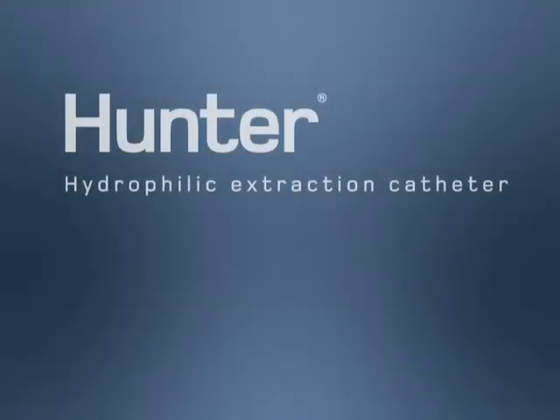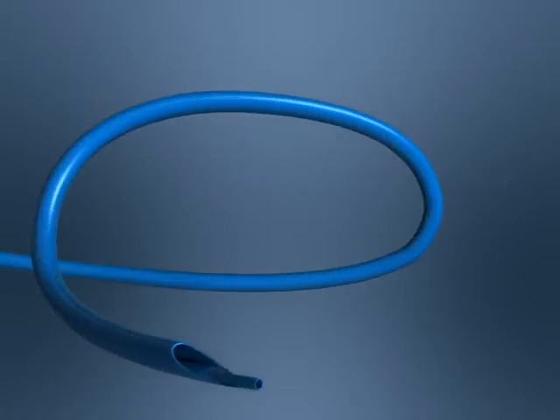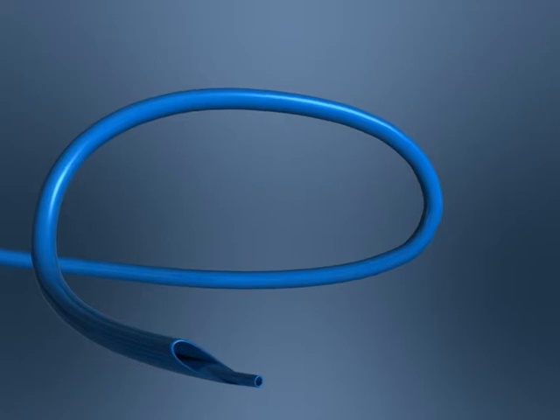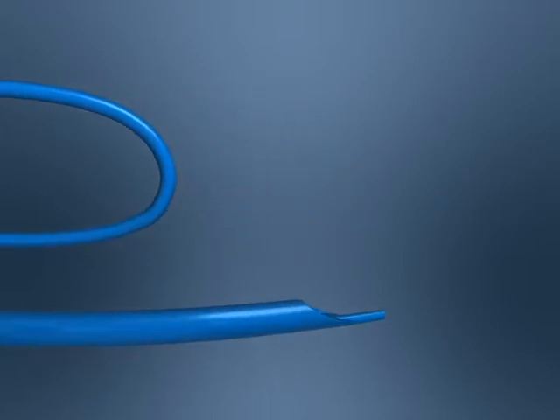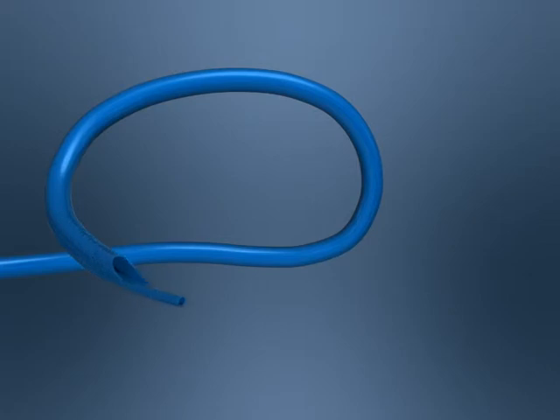The new Hunter device is an extraction catheter indicated for manual thrombus aspiration. The Hunter catheter provides easy and smooth navigation with a wide lumen designed for optimal extraction of the thrombotic material. The distal part provides flexibility and enables navigability. This part is divided into 2 lumens, one for passing the guide and the other for extraction.